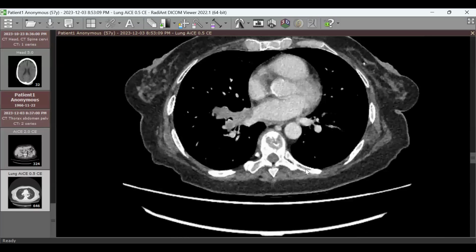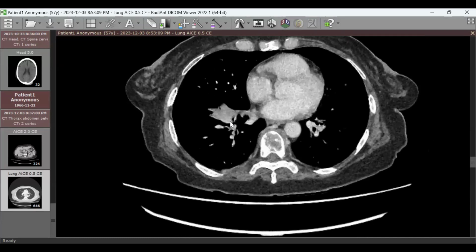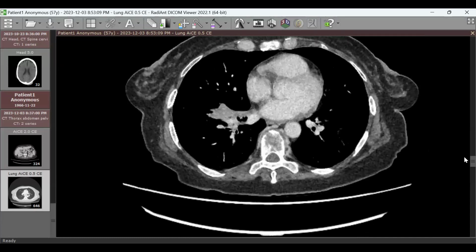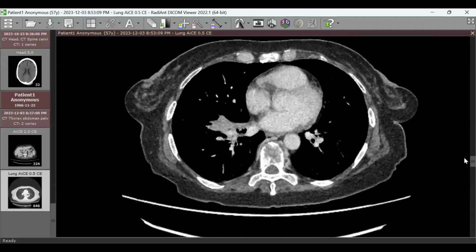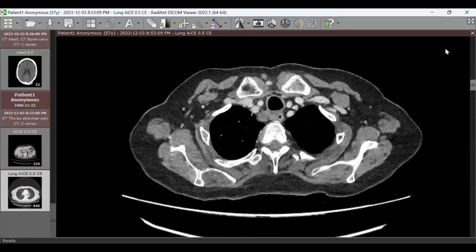Size of the lesion. Good. I can tell you that this size is like 34 millimeters. So this makes it T2a in the TNM classification. So that's cleared now. We got this. We need to focus on the lymph nodes. Lymph nodes, yes. I'll go from above and go downward, and let me know if you see abnormal lymph nodes.